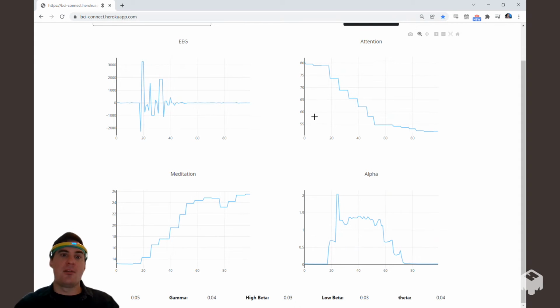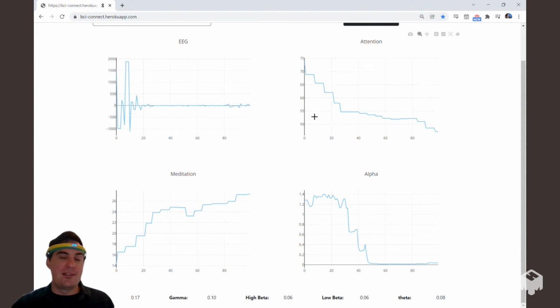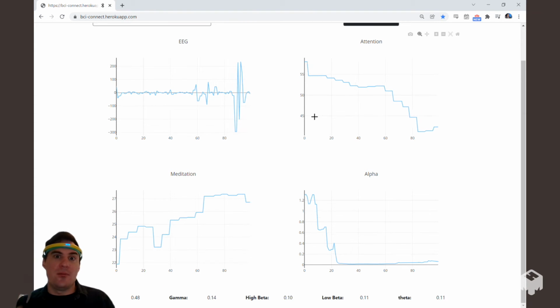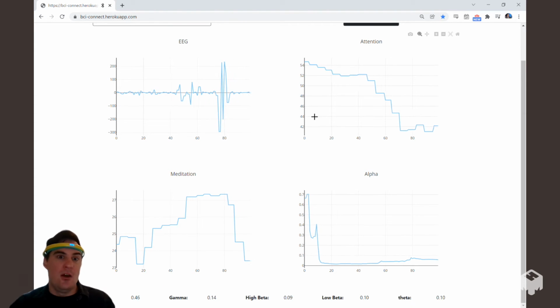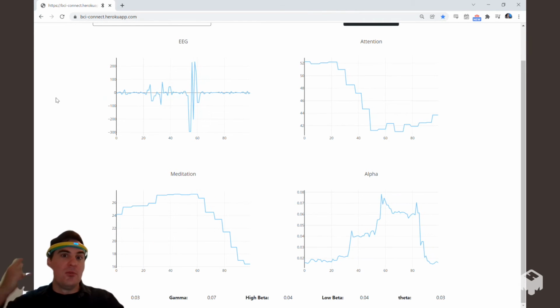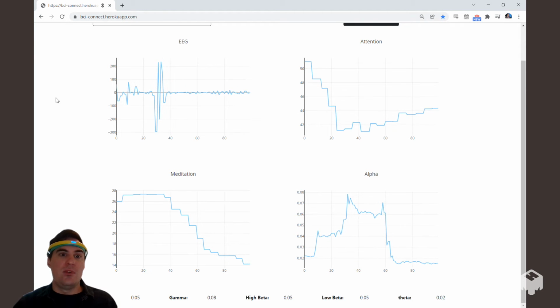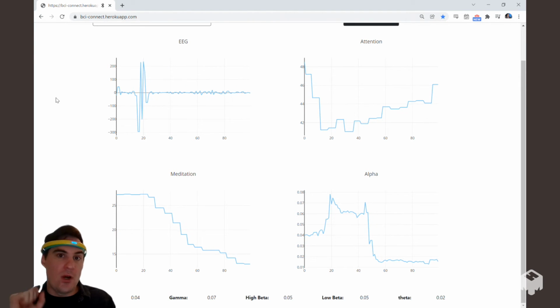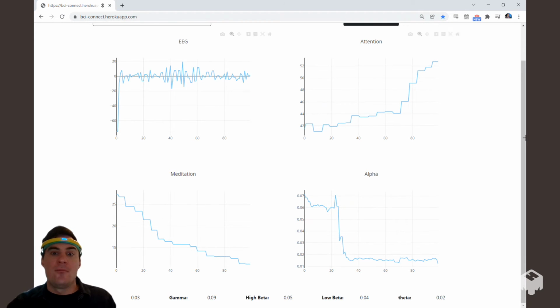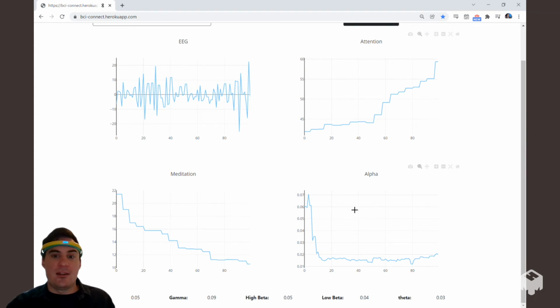So we can see there that these little electrical signals can be measured and we can do all kinds of things with them. So what if, for instance, we wanted to look at something that was a bit more complex? Well, if you actually take these readings here and we do some really fancy math and algorithms over it, what we can do is we can actually find brain waves or other waves within this kind of data. So remember we look at those blinks? Well, now let's take a look at the bottom right here.